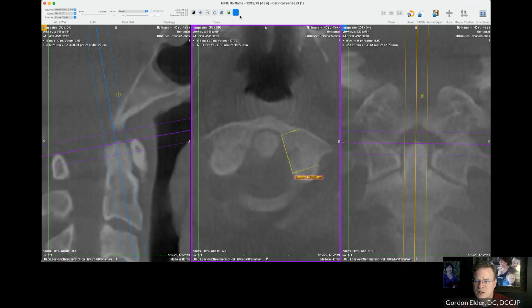What I'm going to do first for this particular program, when I start moving around, these lines are going to disappear. So that I can come back to it later if need be, this particular tool is going to give me, these dots are going to stay in three-dimensional space. It doesn't matter how I rotate or turn. Okay, let's go ahead. So we come back here. Now remember, as I moved this up and down, this did not rotate at all. So if I use this as my central line, and these are parallel lines, I'm going to measure this angle to that one. So we're going to come back up here.